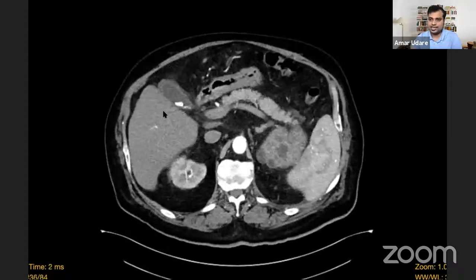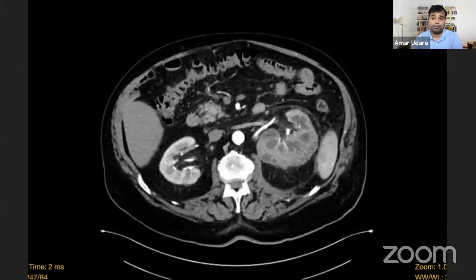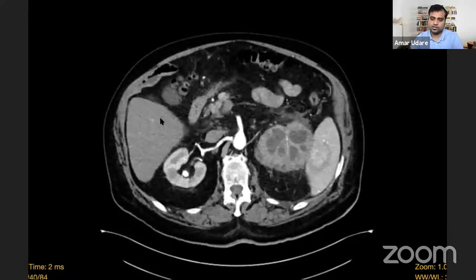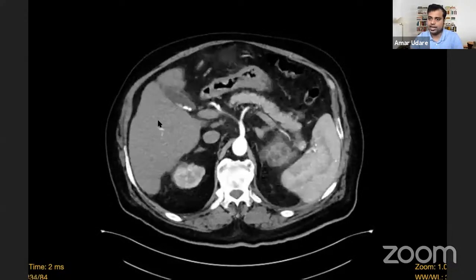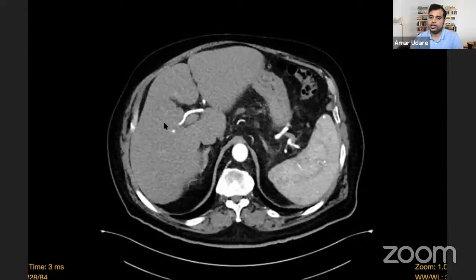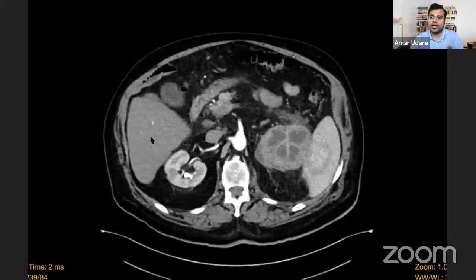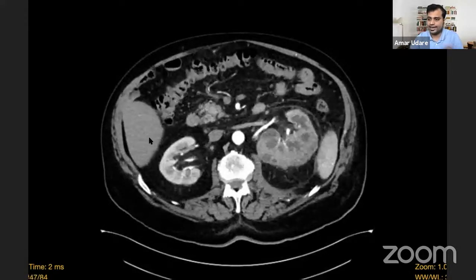Typical imaging appearance would be as I described: a pelvic obstructive calculus and low density soft tissue filling up the renal collecting system. Remember that there are cases which have been described of extrarenal or perirenal xanthogranulomatous pyelonephritis as well. So this is a low-grade chronic inflammation of the kidney.